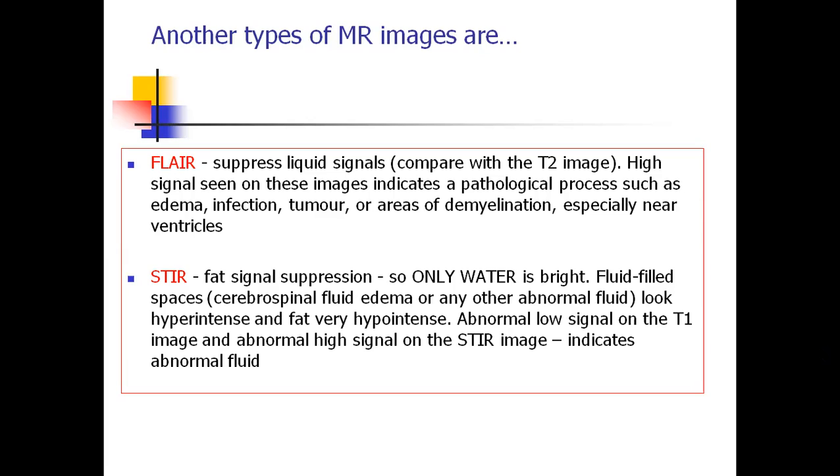One more modality, so-called STIR, or fat signal suppression, the image which suppresses signals from fat tissue so that only water remains bright.